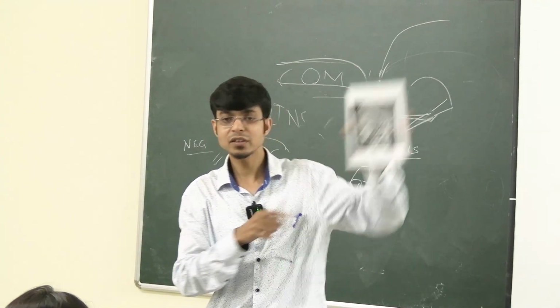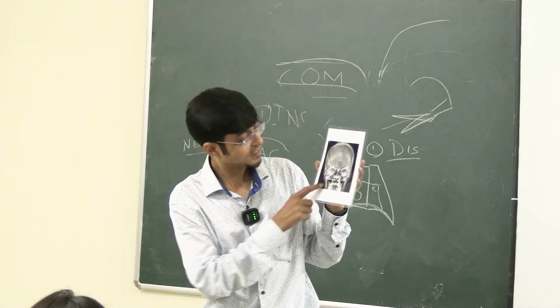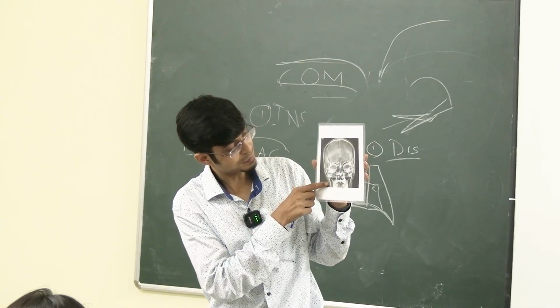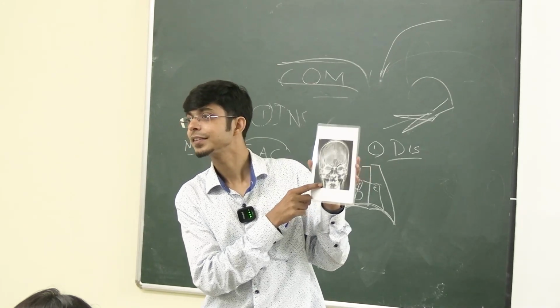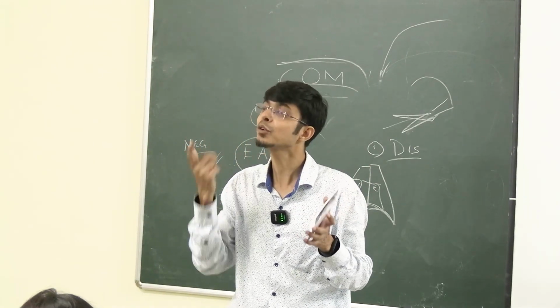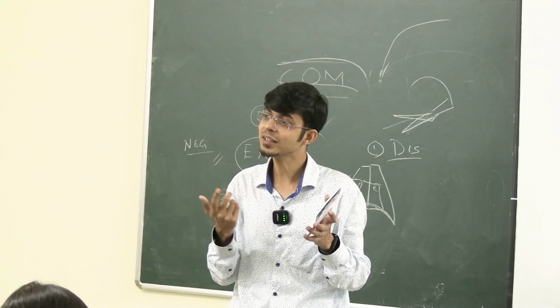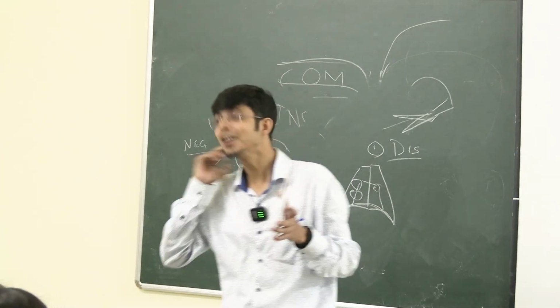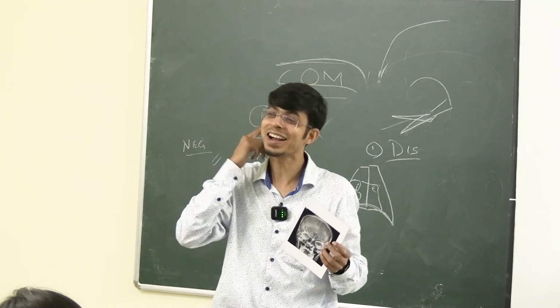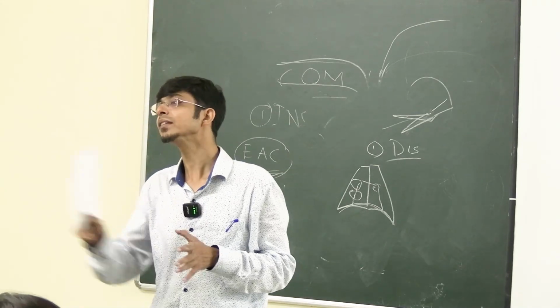Okay. So there is a reverse Towne's view to see the styloid processes. So these are the base. This is the base of the skull from which the styloid processes have emerged. Where is it? The styloid process is near the ear. Where is the styloid process? Down here, the examiner will ask, sir, it is here. The X-ray of what, sir? Of this, or the ear. Below the mastoid is the styloid process. Then what is stylomastoid foramen?